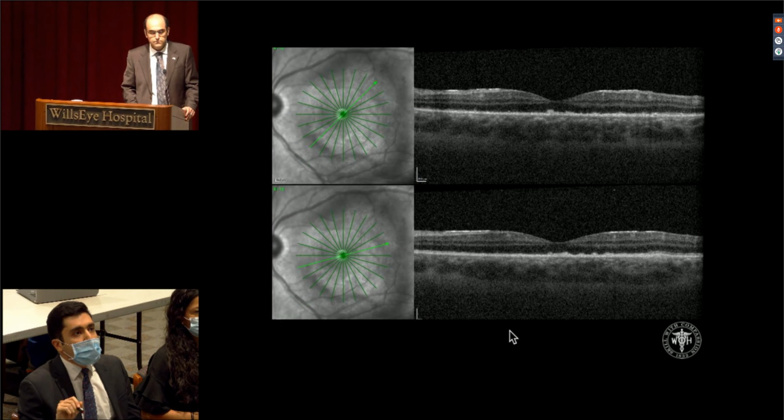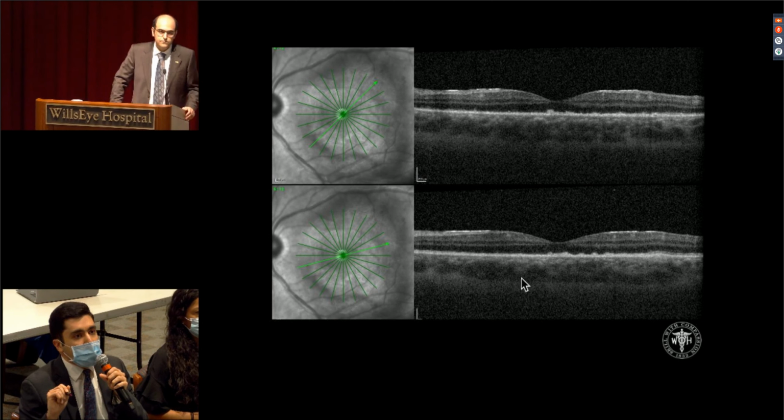And then the left eye, where we have most of the pathology. On the infrared image, we can see these reflectivity changes corresponding to the macular lesions we were seeing earlier on. On the B scans, one cell we can note here, the choroid appears to have a relatively normal thickness and architecture to it. You could argue maybe there's some foci of hyperreflectivity within the inner aspect of the choroid itself, and it's really the retinal laminations which show the drastic change.